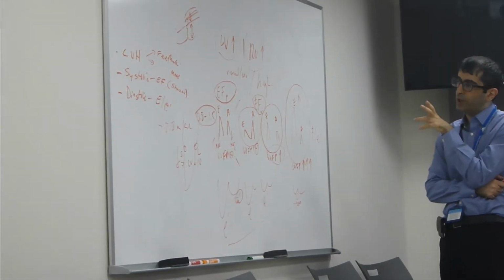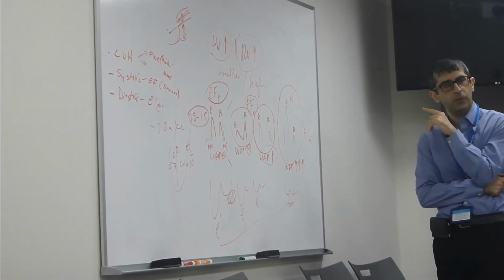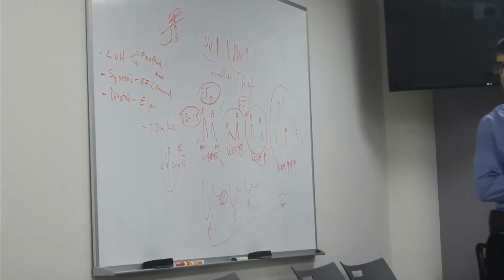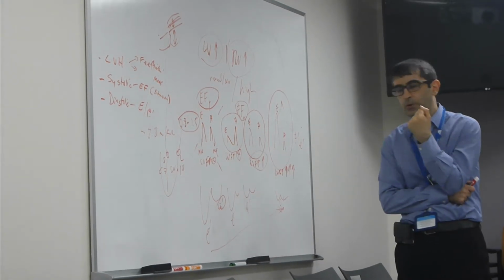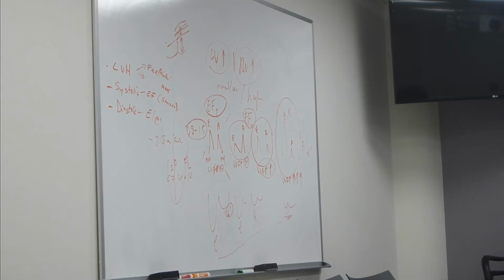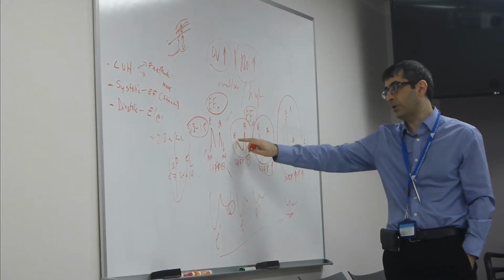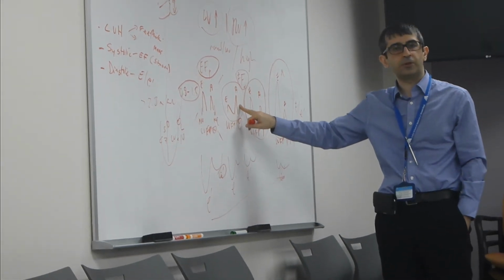Again, with reduced ejection fractions, most of the time you can get away with just E velocity. The reason is that your recoil is going to be low, so your compliance is going to be low anyway. So in patients with low EF, the tissue velocities are usually low, especially if we talk about somebody with EF less than 30. In these cases, if you have this type of filling pattern and E velocity is low, less than 50, you can be quite confident that the filling pressures are normal.